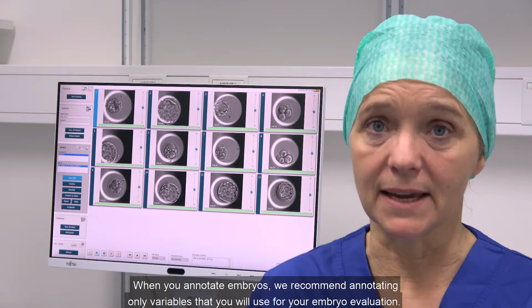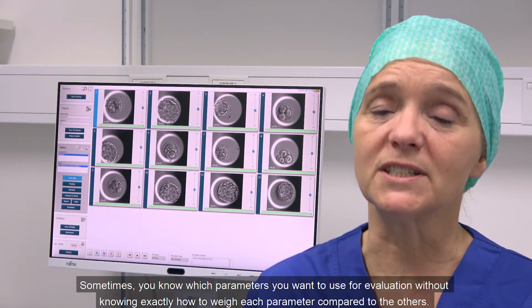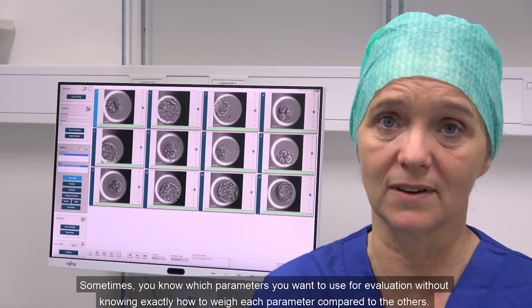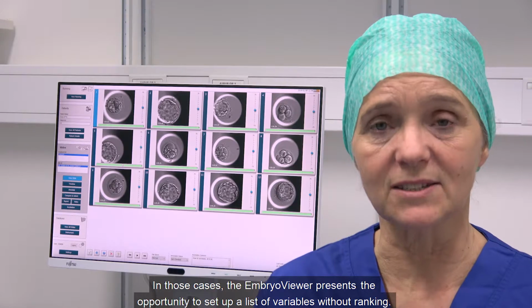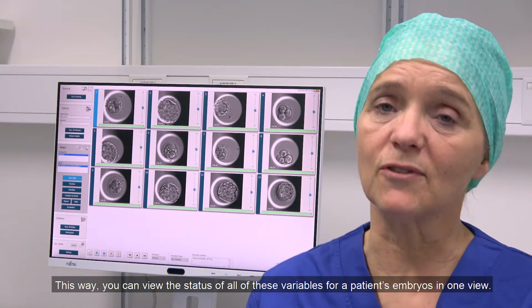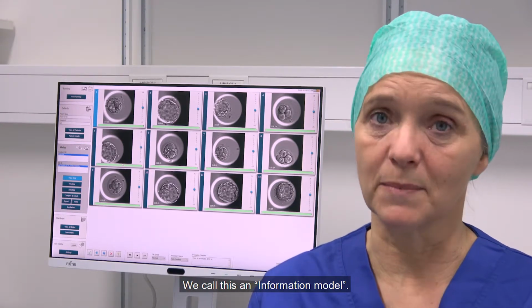When you're annotating embryos, we recommend only annotating variables that you will use for embryo evaluation. Sometimes you know which parameters to use for embryo evaluation, but not exactly how to rank one parameter compared to another. In such cases, the EmbryoViewer software has the opportunity to set up a list of these variables without ranking. In this way, you can view the status of all these variables for all the patient embryos in just one view. And we call this an information model.